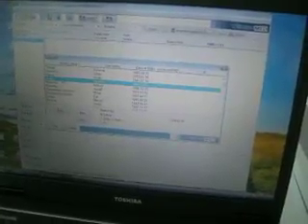Either you can search by using the quick search function, and by quick search function I mean if you press a series of letters here on the keyboard, it will search for the initials of the family name. So if I press TEST, once again TEST, it will jump to test.